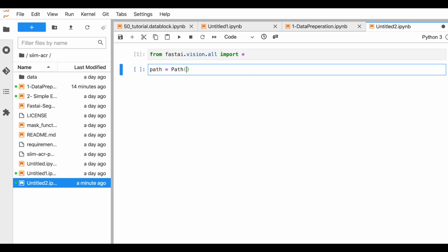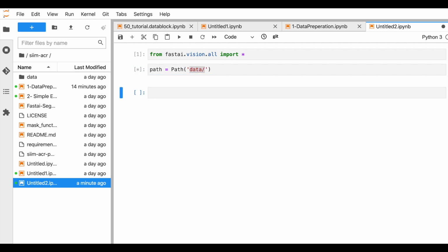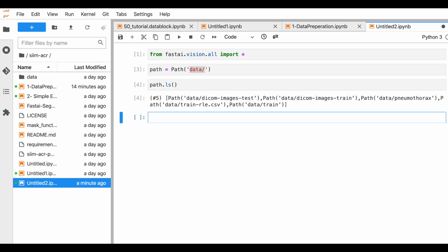So what is going to be the output? I would assume that's data. Because it has to be a string, it's not a variable, and that's what it throws. And then there's this amazing function called ls, which lists all the files inside that particular folder. It's always a good idea to test whatever code you have written rather than keep on writing multiple lines of code. So I want to make sure the images directory is there in this folder. I did an ls to see it's there.